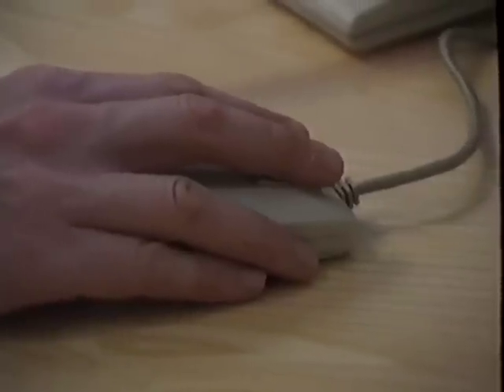The rubber band drawing using a mouse or trackball has been proven to be the technique that is most easy to handle.